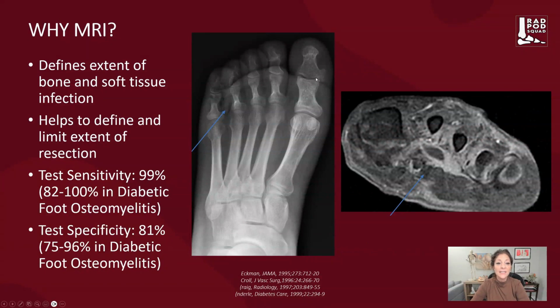And here we can see in this X-ray evaluation, my big arrow is pointing to this region of this juxtaarticular osteopenia seen in this location along the MTP joints. And we can actually see this vague area of lower attenuation or these low attenuation densities seen in the soft tissues. And that on this post-contrast imaging is showing itself to be an abscess in that area of the metatarsal, deep to the metatarsal fat pad.